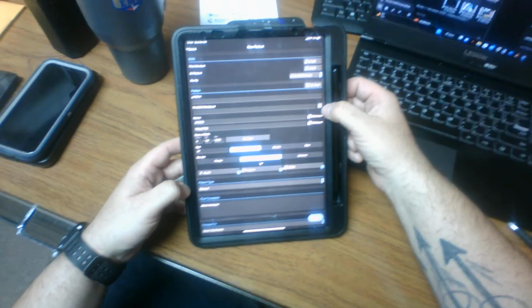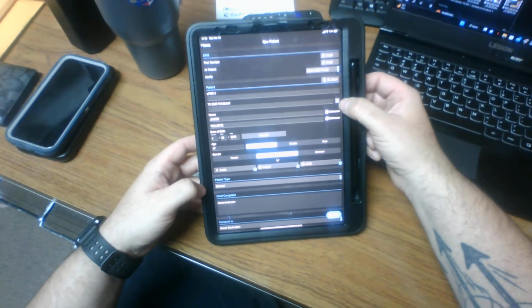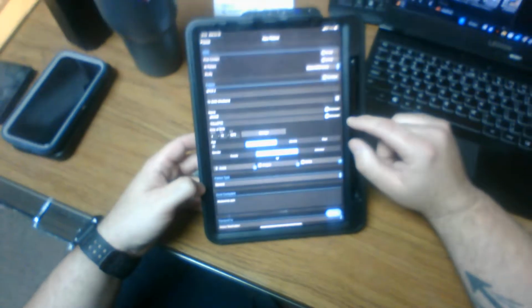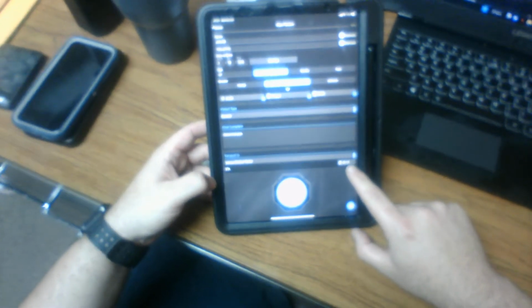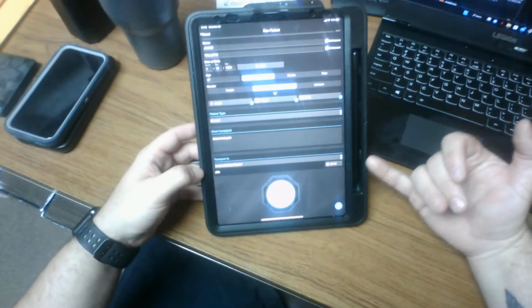Now, there's a little icon over here for scanning a wristband. The wristbands are blue in color, and it's got a special barcode on it. We click that, we scan the barcode, it now attaches a special number to that patient. The last thing you do is you set your destination. Once you set your destination, it'll set an ETA. It gives you about a 20-minute ETA once you set. It's not set in stone, and we can change it.